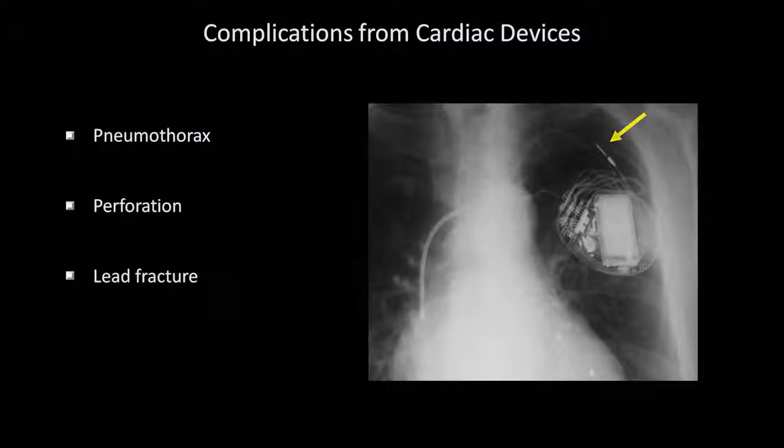How did this happen? Over months to years, possibly as an anxious habit, the patient has fiddled with a subcutaneous device in a repetitive pattern such that it has rotated around several revolutions within the pacemaker pocket in the chest wall. This has pulled the right atrial lead back, which is coiled up behind the device. This is called Twiddler's syndrome.